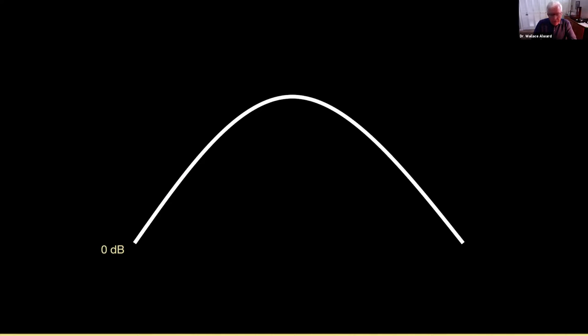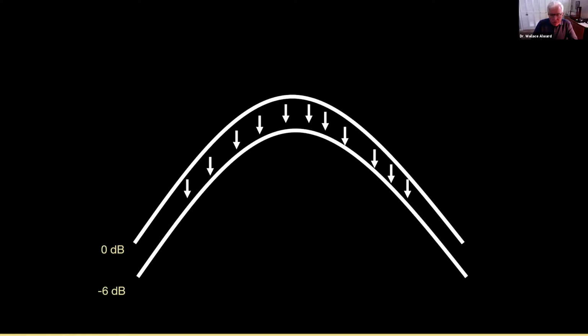So why does that happen? If you think about how the pattern deviation is calculated, the concept is that here's the hill of vision, right? And so you have something like miosis or cataract, usually cataract would be the most common thing, or corneal edema, all the points are depressed. And so the hill of vision is set down, the expectation for all the points is set down. And then what the perimeter is looking for is whether or not there are focal areas of loss in this overall depressed visual field.